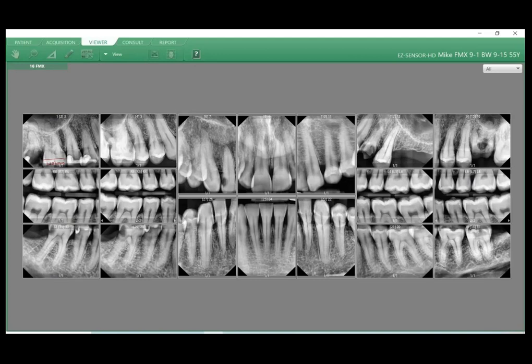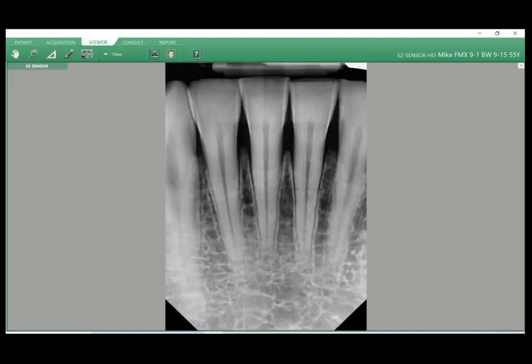So from here, just navigating, it's really easy. Just double click on any image I want to take a look at. There's a bunch of options up here, and then right click options that we're going to discuss. Most commonly, the windowing section on the left, we have brightness and contrast. I have my sliders there. Also doing a right click on the image does the same thing. If I right click and drag, it affects the brightness, and the contrast is up and down, or grab the sliders, same function.